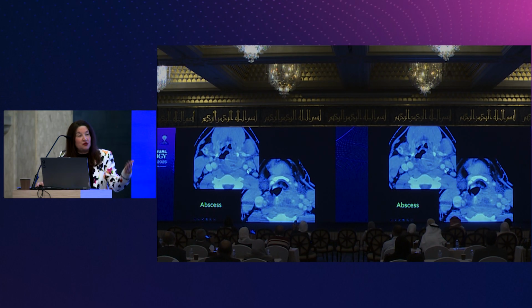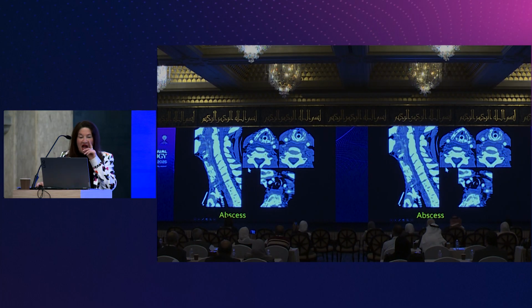This is what the acute abscess in the first 4 days actually looks like. This is what abscesses look like when they mature. So this is somebody you can see very sick, they're intubated, they've been on IV antibiotics and the abscess has not gone away. You can see the fluid in the retropharynx, right? You've got the constrictor system anteriorly and the prevertebral muscles posteriorly, and now we see eloquently the retropharyngeal compartment, again, constrictors in front and muscles behind.